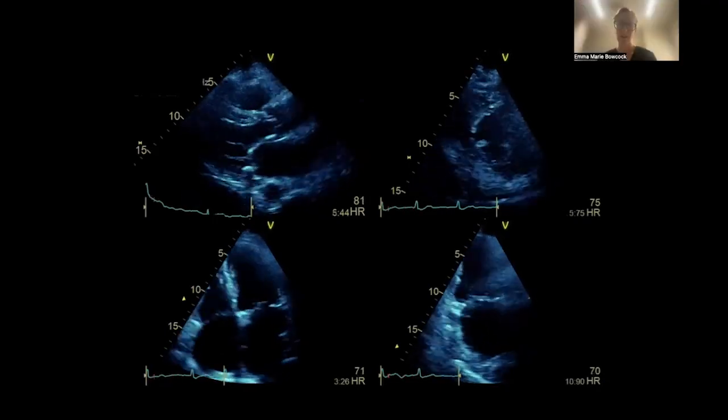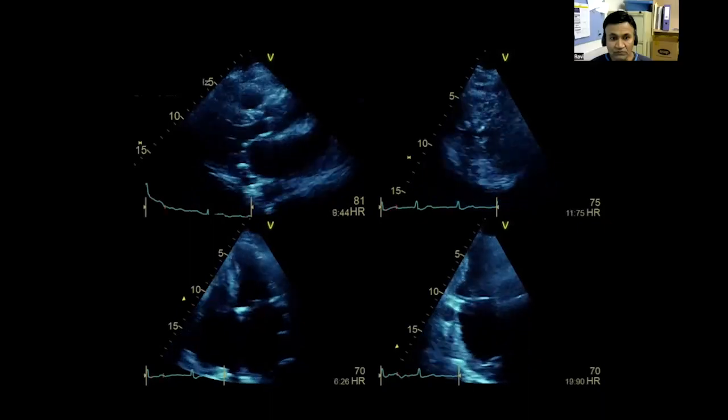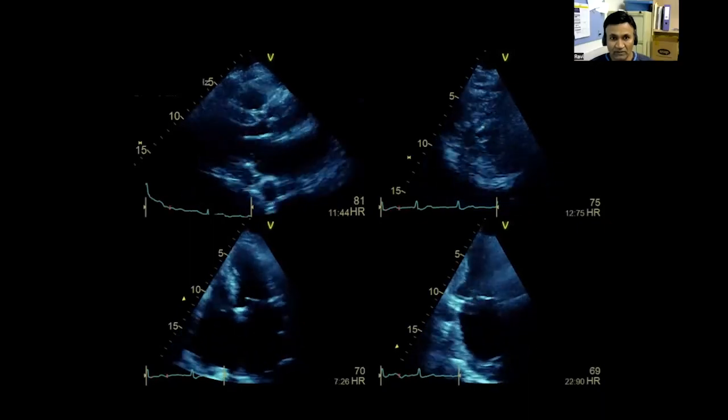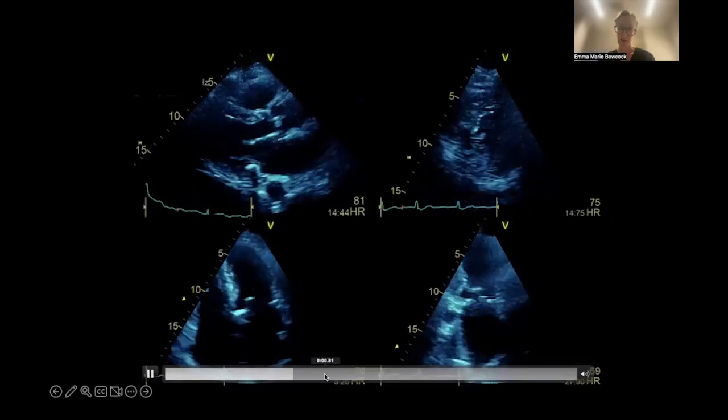Cool. All right, so we comment on these, Ravi. Tell us what you see. So should I go with one image at a time or overall? Yeah, maybe start with this one and then sort of work around clockwise.